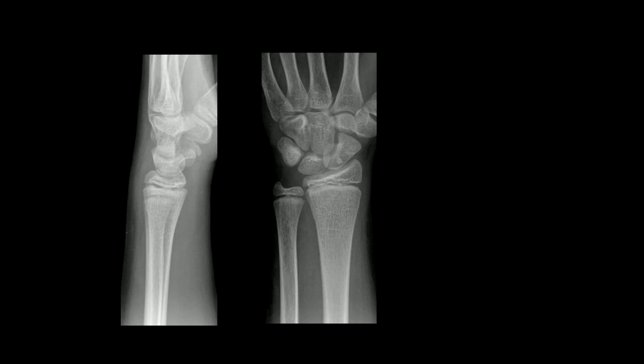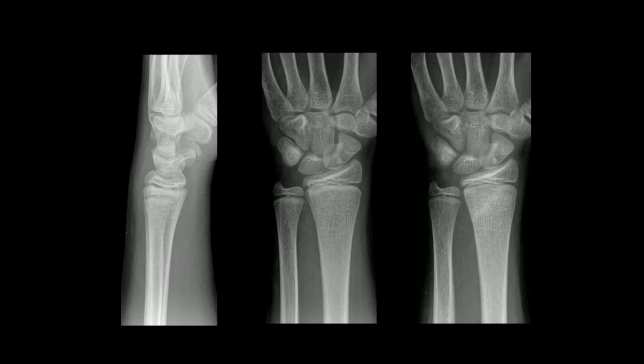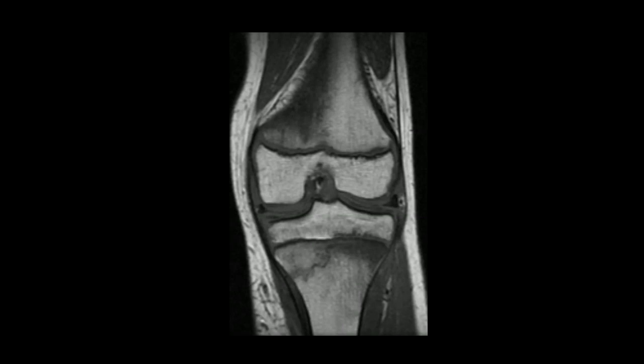However, these fractures are not always radiographically evident, as in this child who sustained a fall on an outstretched hand and presented with wrist pain. Initial radiographs were unremarkable, and then in follow-up with persistent pain, we can see the sclerosis, which indicates that there is a healing Salter-Harris type 2 fracture. Another patient sustained a knee injury, and there was a high suspicion for fracture, which was not seen on radiography, and so the patient underwent MR imaging, which demonstrates the Salter-Harris type 2 fracture.